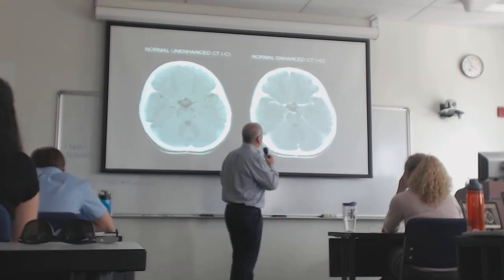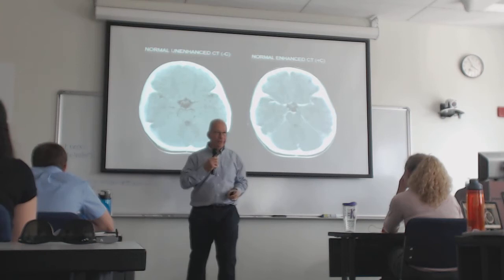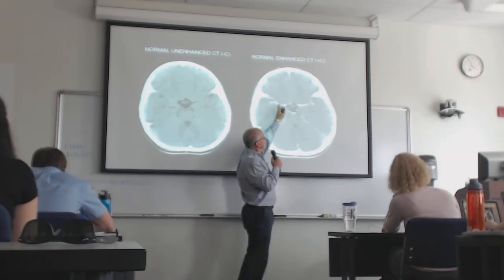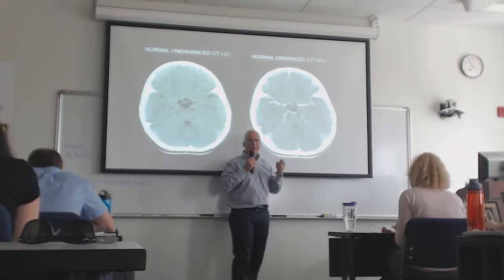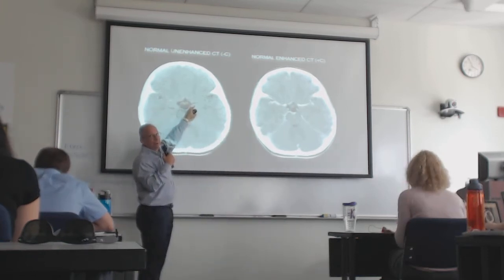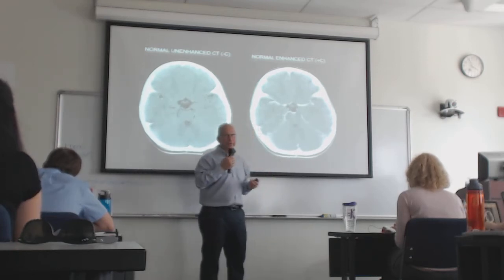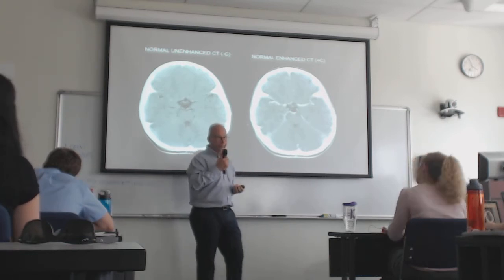This is the patient that got intravenous iodine contrast, so the blood in these blood vessels, the middle cerebral arteries, has iodine in it and is now denser than the blood was before we gave them the iodine. And it just happens that in the brain, the meninges also love iodine contrast, and you'll see the meninges better.